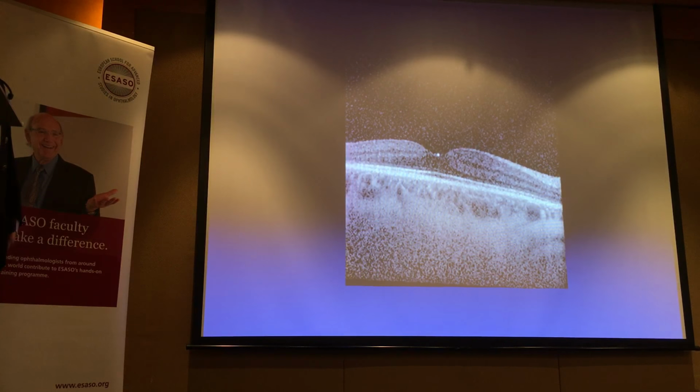Anyone? Patient's vision is 6/6, asymptomatic. What is that? It could be normal.